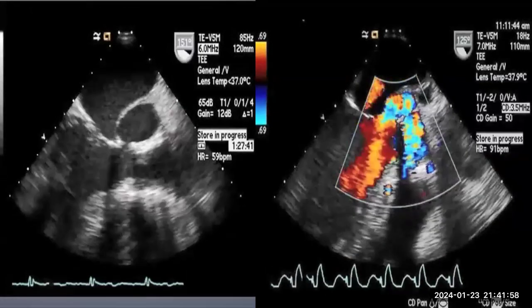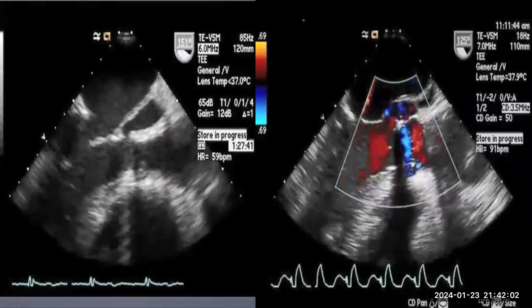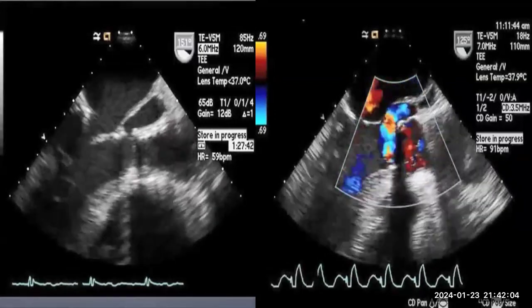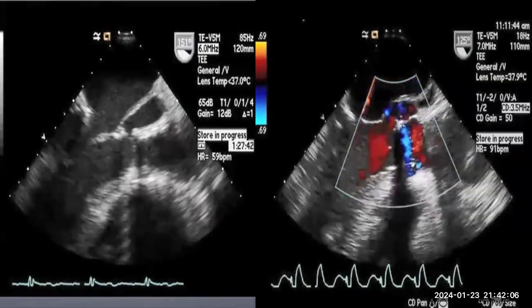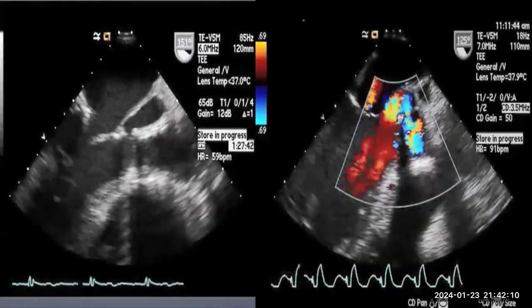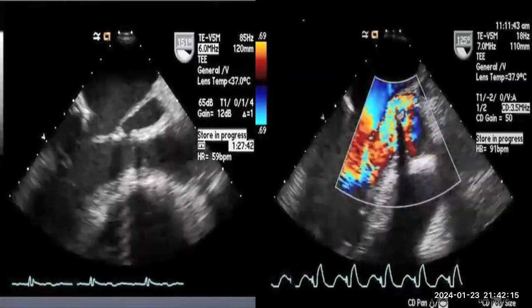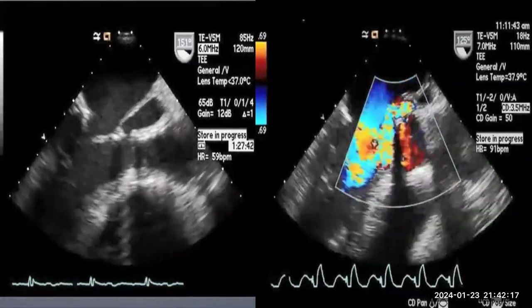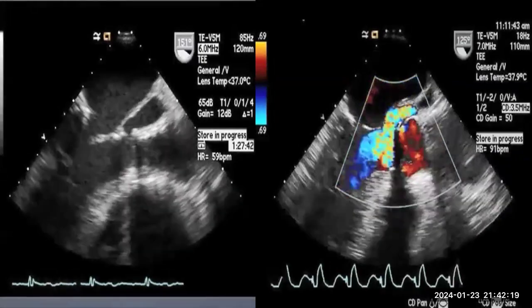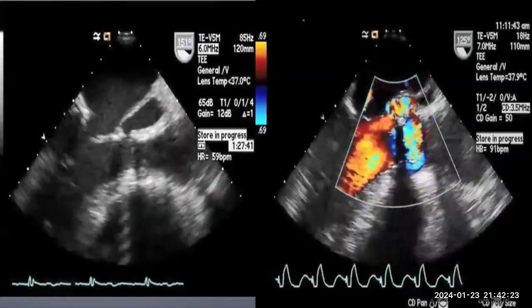In the sheet, I go to prosthesis valve. ايوه ممتاز. نختار aortic bioprosthesis. ايوه احسنت. شو اسمه pathological regurgitation لا rocking dehiscence. Okay. You can choose all. You have bioprosthesis aortic valve, you have pathological regurgitation, and as you mentioned, rocking dehiscence.